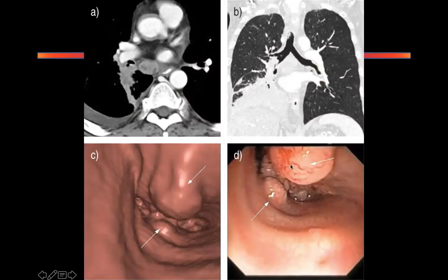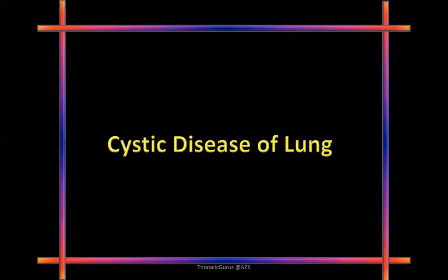So here you are, here's the correlation, here's the tumor. And even before you've gone in with bronchoscopy, you know exactly which segment to look for. And using that, your biopsy yield goes up. There are some papers talking about this increase in the yield of bronchoscopic biopsy secondary to the use of virtual bronchoscopy. Okay. All right.